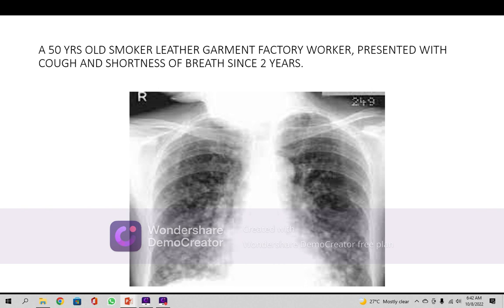Which type of pneumoconiosis is this? It doesn't matter. You have to take out the region and biopsy it. It may be anything like carbon. It may be other than beryllium, some other material like cotton, byssinosis that is called, silicosis, and others. We cannot say.